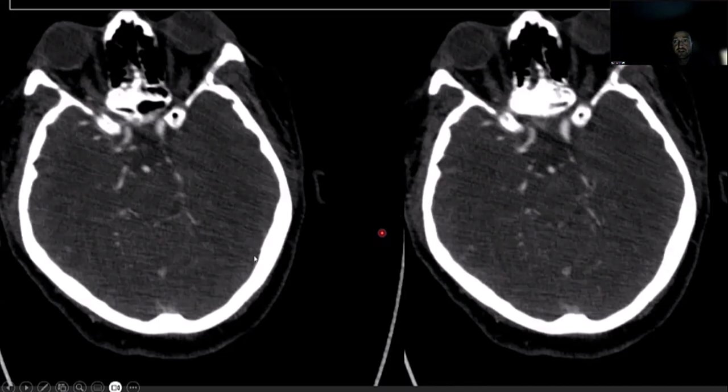This is just another thing to look for during your scan. Obviously, you have large vessel occlusions, but there are other things that can cause strokes that don't always have large vessel occlusions. So it was a young patient with significant irregularity of her right supraclinoid ICA. Charlotte, this may give you nightmares from, actually, I think you did very well in this case during the mock oral.